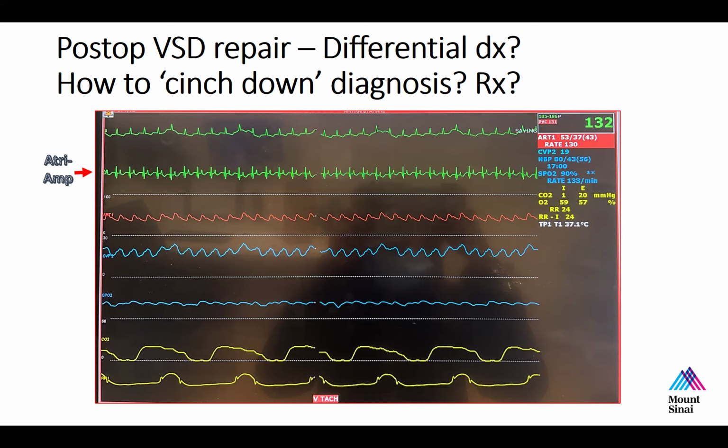It seems as if it's a little wide, so I would think it's probably some kind of ventricular rhythm. Yeah, okay. That's certainly, I would say, number one in the differential diagnosis, that this could be ventricular tachycardia of some sort.